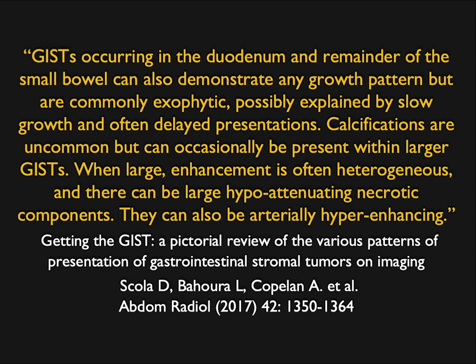One thing also with GIST tumors is that it is rare to see calcification. Remember, with carcinoid tumors, calcifications are indeed common. And sometimes with GIST tumors, I think the biggest challenge on the larger ones is not so much to see them, but to really recognize that they're really small bowel, because I have a few cases, and maybe we'll show some of them, where the tumors are so large, it's just really hard to figure out what their epicenter is.